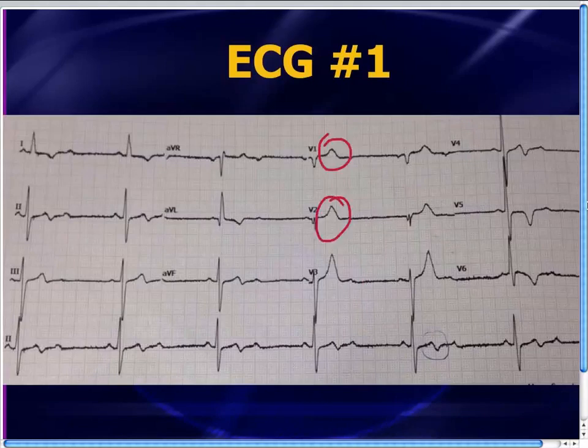The other interesting thing that you notice on this 12-lead EKG is that the T waves in V1, V2, maybe V3 also are a little bit disproportionately large. And in a person who's actively having ischemia or cardiopulmonary symptoms, when you see disproportionately large T waves in comparison to the QRS complex, you worry about acute ischemia. That could be what sometimes people refer to as hyperacute T waves. And then there's signs of LVH. There's flipped T waves out laterally, and those appear to be more chronic type of things. Anyway, this patient did not turn out to have an acute coronary syndrome. The main issue with this patient was the rhythm.